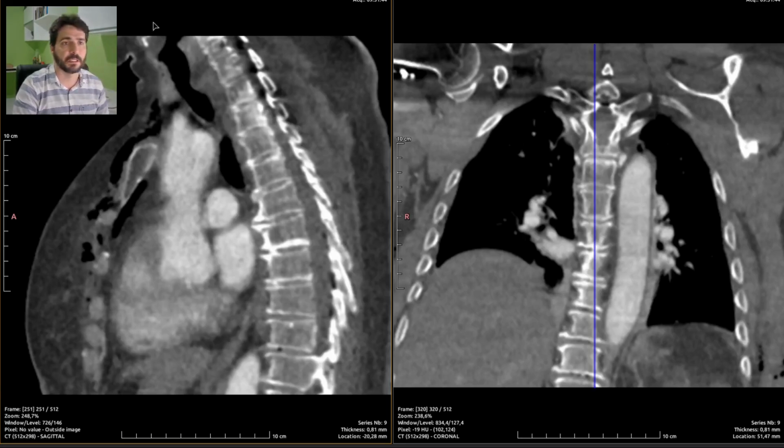Normal template in place. I'll just sign it off and move to the next patient, because these kind of exams will not report themselves. You know, exams don't report themselves. The platform is kind of slow today, and this is a live recording. This is what it is. I can't really speed it up, and I'm not going to spend my time editing this video way too much. I don't have free time for that.